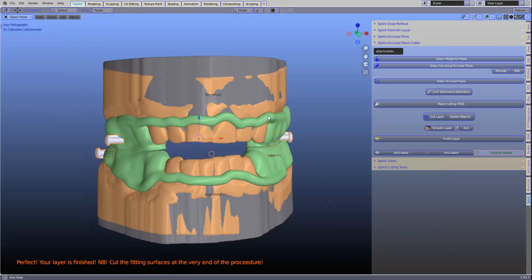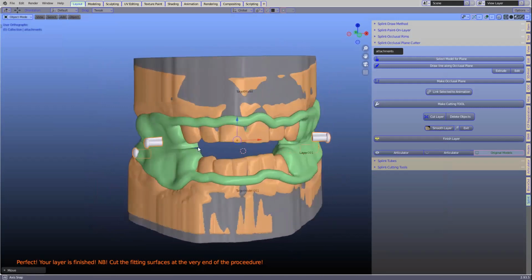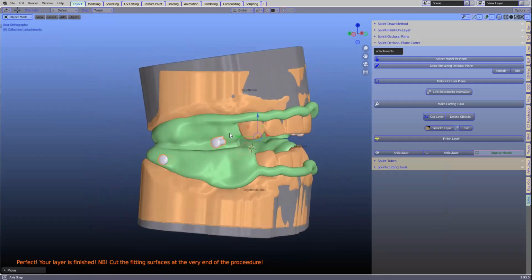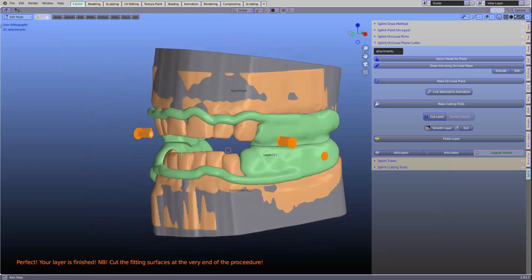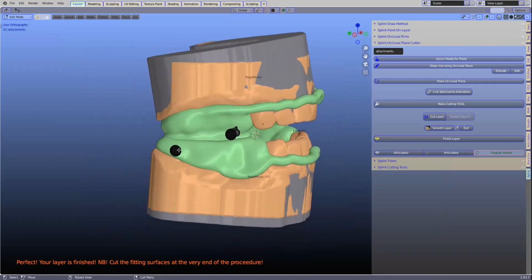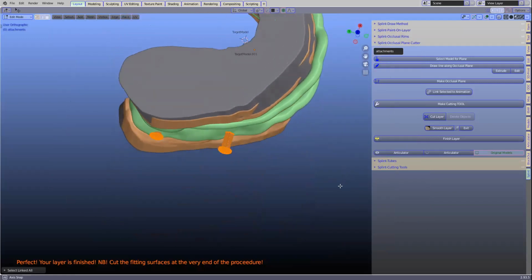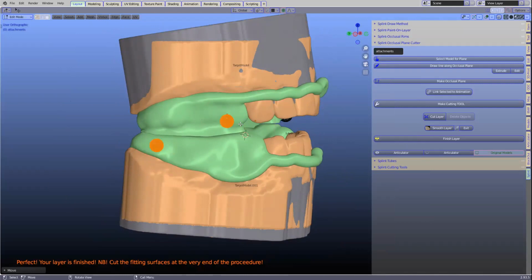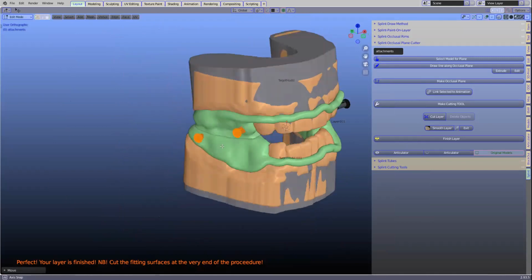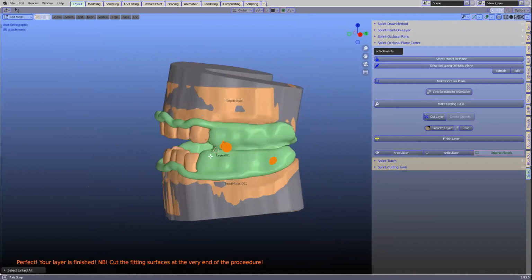Attachments. Okay. Now these attachments are all in one, and we're going to place these in edit mode. Okay. So we can move things in edit mode, and for good reason, and I'll show how this works. So you're going to go Tab, and Alt A, select this one, Shift left click, select, and then Control L on your keyboard to link them. Notice none of those are linked. Control L links all of the vertices together.